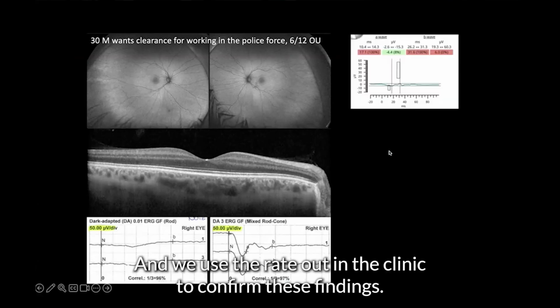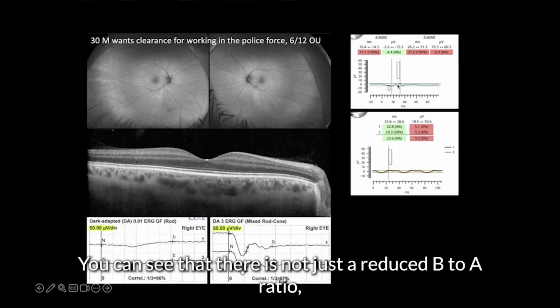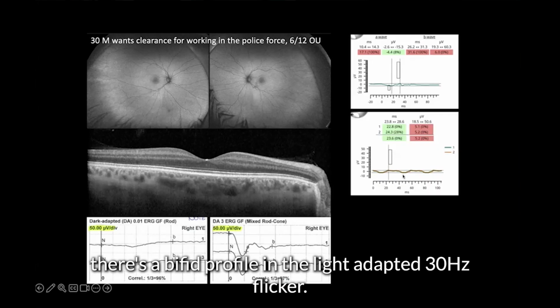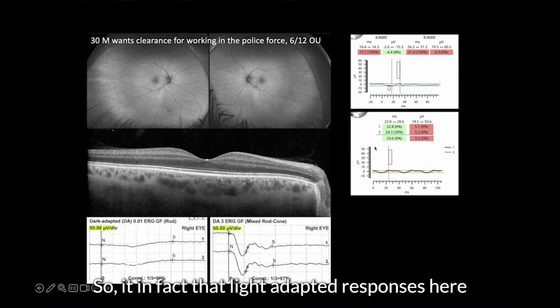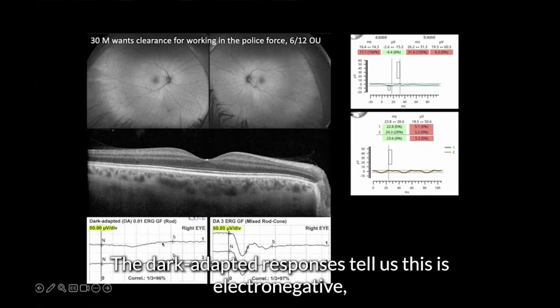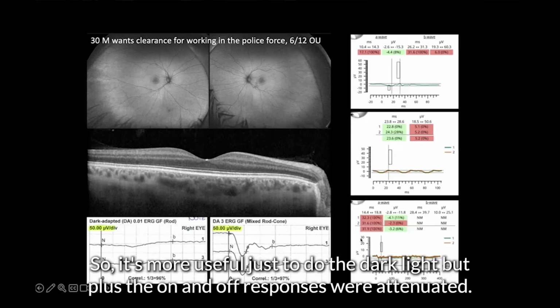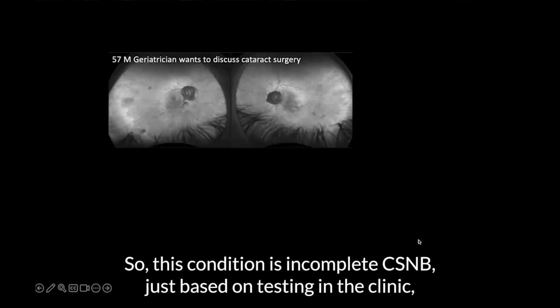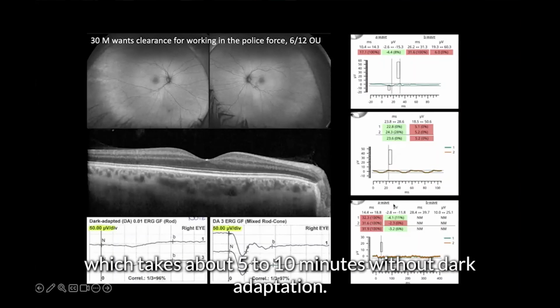And we use the RETeval in the clinic to confirm these findings. You can see that there is not just the reduced B to A ratio, there's a bifid profile in the light adapted 30 Hertz flicker. So in fact, the light adapted responses here gave us a diagnosis. Whereas the dark adapted responses tell us this is electronegative, but actually doesn't tell us which type of disease it is. So it's more useful to do the light adapted, plus the on and off responses were attenuated. So this condition is incomplete CSNB, just based on our testing in the clinic, which takes about 5 to 10 minutes without dark adaptation.